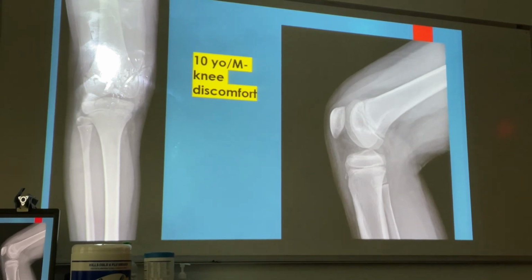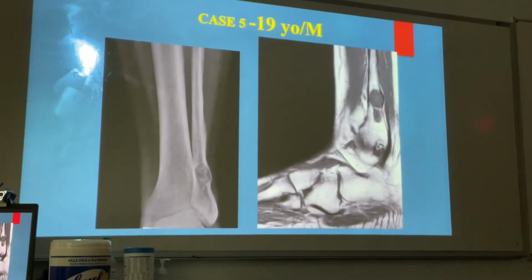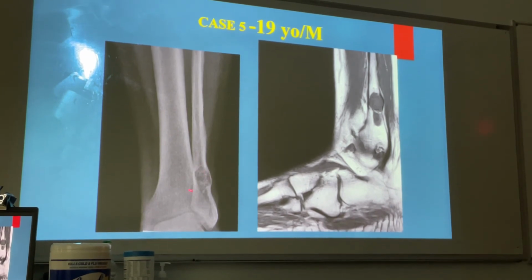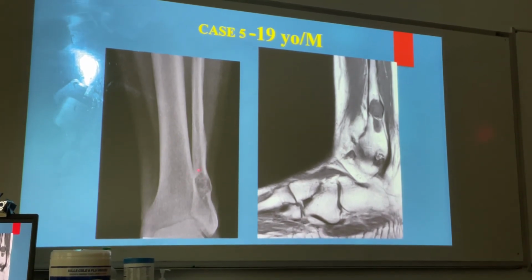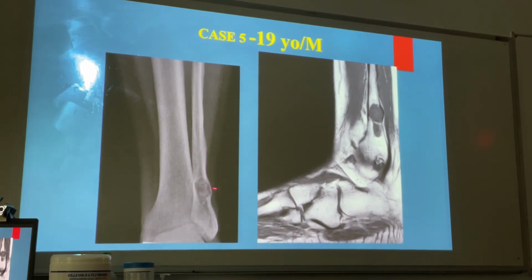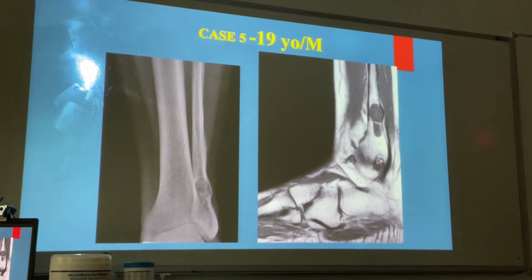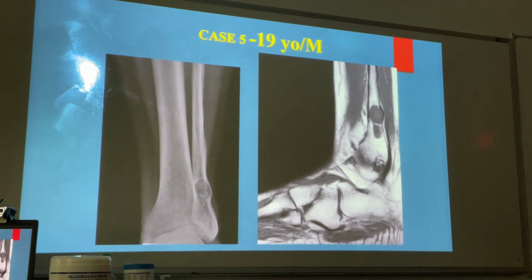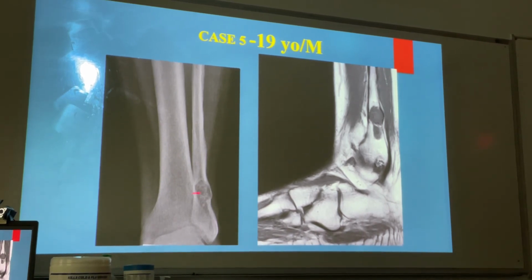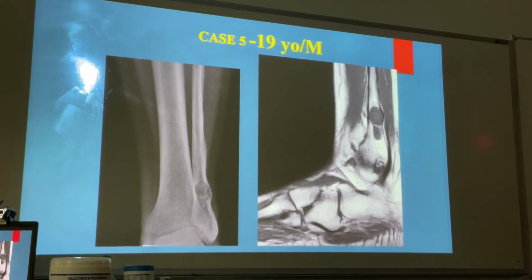No. Okay. All right, we're going to show you ankle, all right? So this is not normal. I've got enough information to make a good clinical decision, but the teaching point is what happens when things expand beyond the confines of a bone, the cortex. And break. It's not good. Not good, can fracture, okay? Especially if someone kicks this person, okay? On the lateral distal side of the fibula, in anatomic position, left side.